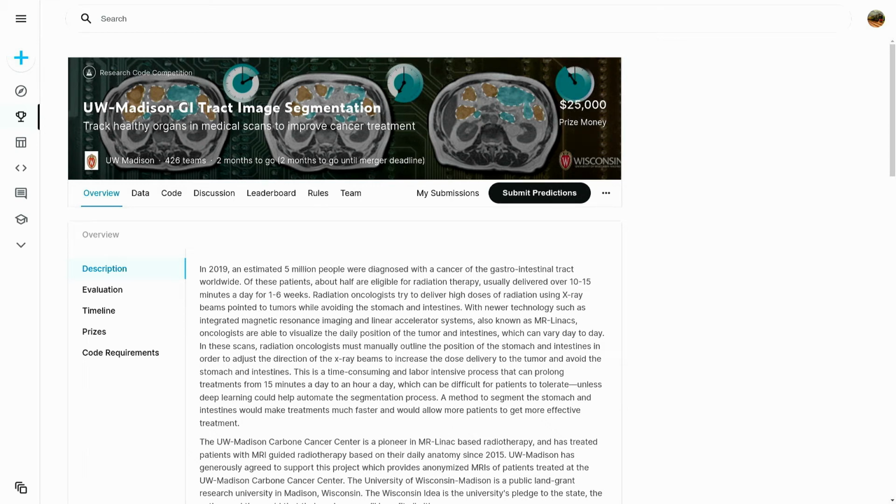In this video, I will take an attempt in this live Kaggle competition where the problem is to segment the stomach and the intestines from patient images who are diagnosed with the cancer of the gastrointestinal tract.